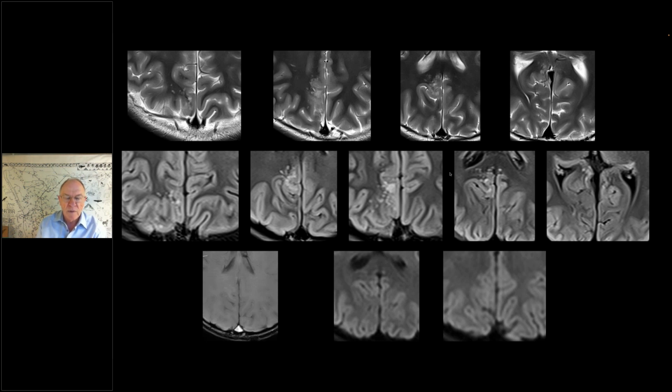If anything, I would just do a FLAIR sequence and leave it at that, frankly. Yeah, maybe leave it, because with parents, doctors, pediatricians, something which looks so incidental, if we keep doing the FLAIR, it will never go away. So maybe, Krish, if it's fine, then maybe leave it, because there will be no end to it.